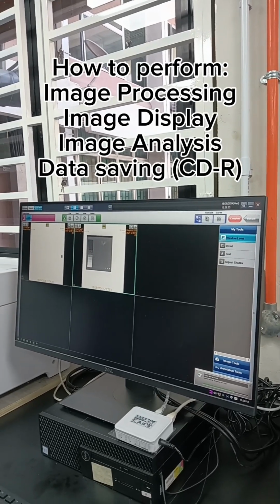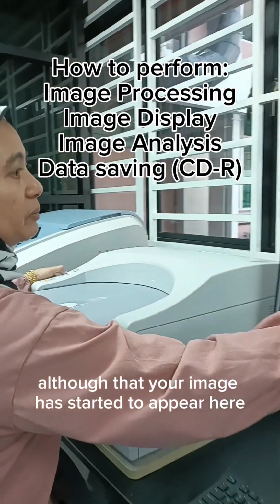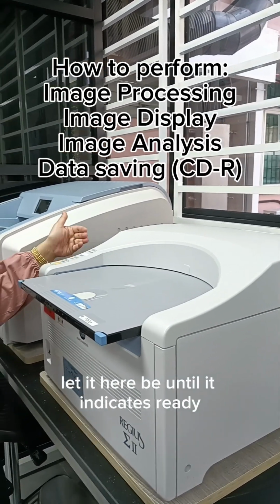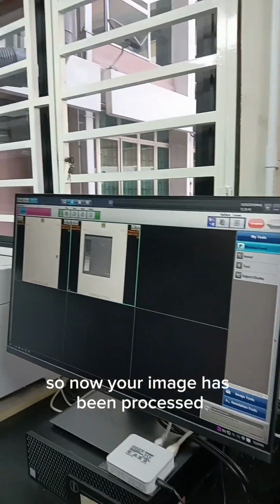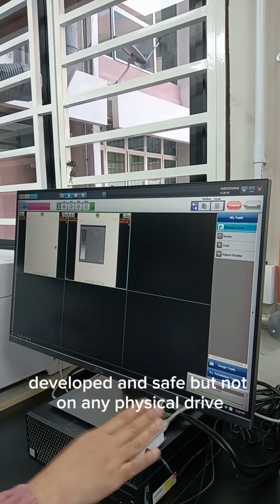Alright. You would see here, it would still be busy, although your image has started to appear here. Do not attempt to remove the cassette. Let it be here until it indicates ready on the button. So now your image has been processed, developed and saved, but not on any physical drive.